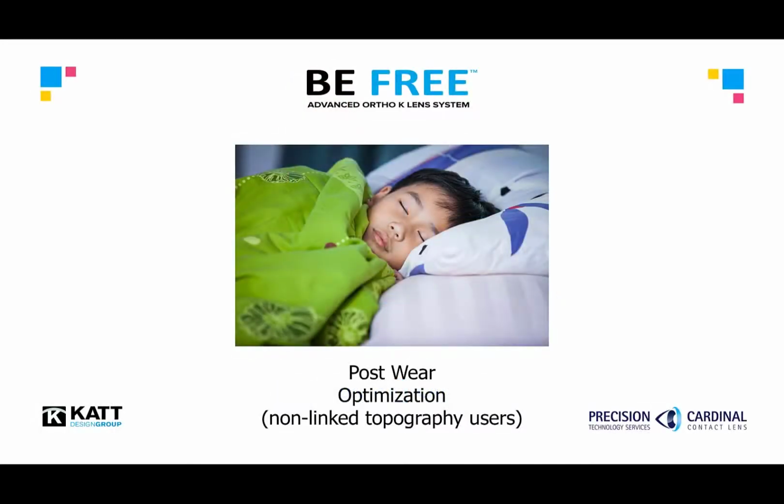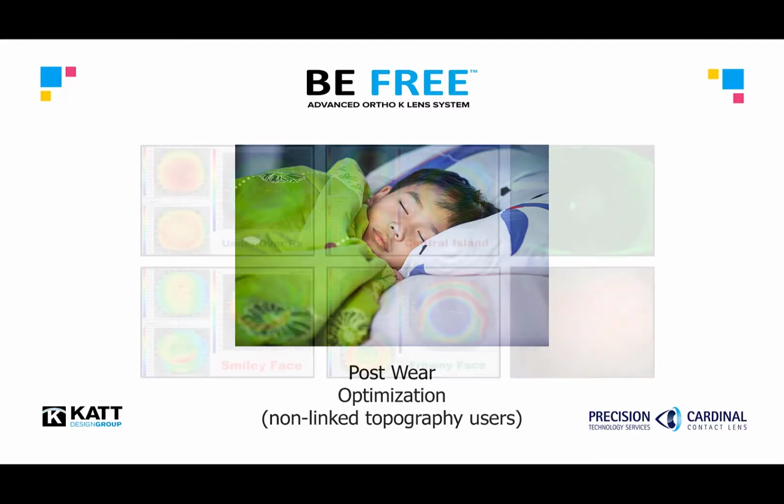This video covers lens modification and optimization in the BE FREE software for users without a linked topographer to the fitting system. Practitioners with an integrated topographer should review the video on the post-treatment response for linked instruments to the BE FREE platform. This training tool is designed to instruct practitioners on the simple and efficient method to modify lenses in the BE FREE software.